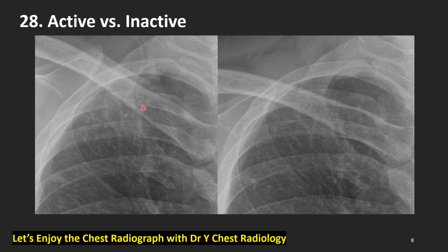M-O-T-T-L-E-D, mottled densities here. How about after treatment, after several years? Not crowded anymore. No more ill-defined nodules, no more mottled density. Only fine, streaky, well-defined small nodules. This is inactive, this is active.